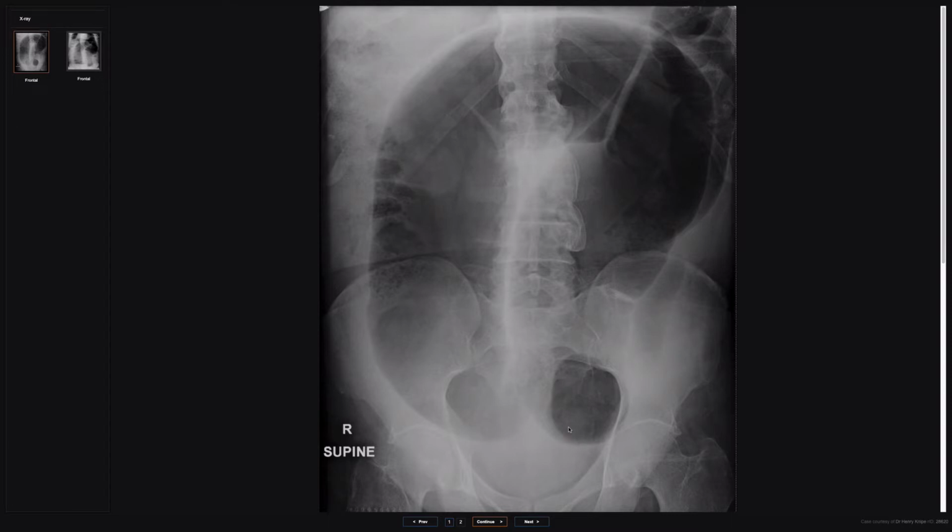But really importantly, look for the normally positioned cecum and ascending colon, like you see here. We've got the cecal pole over here with some gas within it and some fecal matter, and then the ascending colon here running up to the top. Okay, so it's overlapping the edge of this distended viscus. So that means that the cecum and ascending colon are in a normal position. So this cannot be cecal volvulus. So this has got to be sigmoid volvulus. Very helpfully, there's no gas in the rectum, so that indicates it's a soft sign that there's an absolute obstruction.